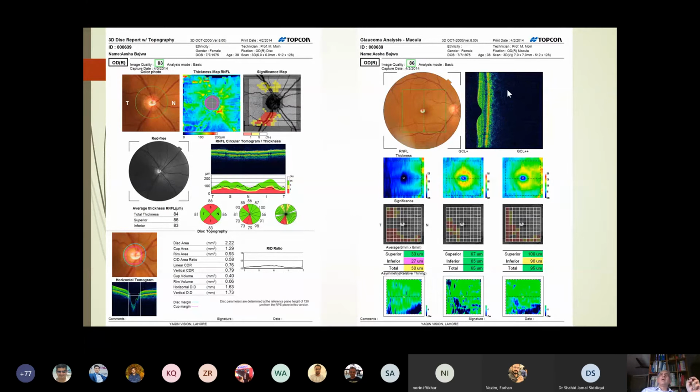Then we go on to our retinal scan or the foveal scan. The picture of the retinal scan looks normal. The foveal cut is good. And the normal yellow donut is present as well in the perifoveal region.